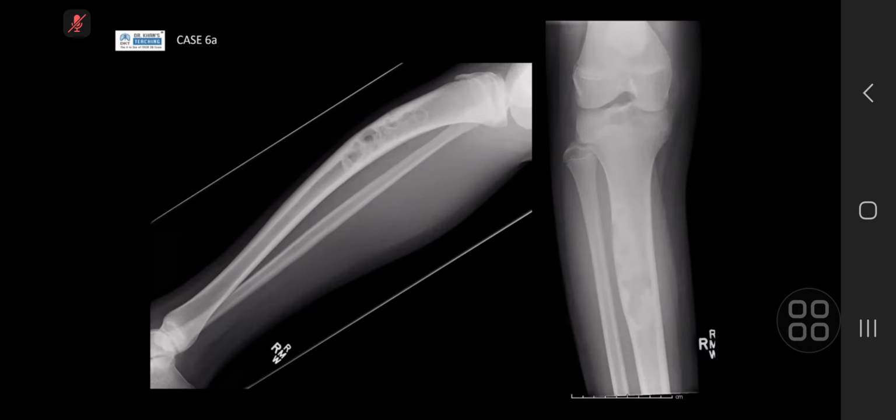The tibial epiphysis appears to me a bit ballooned, and also the medial femoral epiphysis. Sorry, what's ballooned? I missed that. On the medial aspect of the tibiofemoral joint, the epiphysis appears a bit ballooned. There is an asymmetry between the lateral and medial femoral and tibial epiphysis.